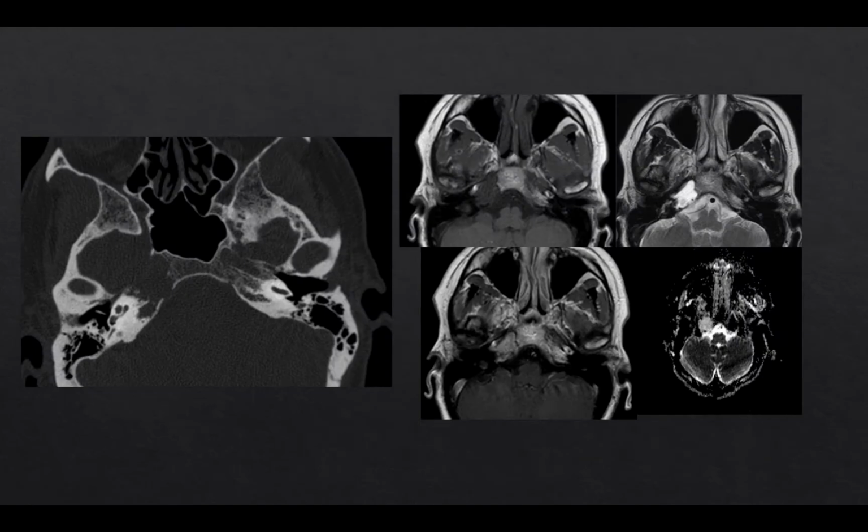Now let's get into more of the aggressive lesions of bone of the Petrous apex. On the right, we have a destructive lesion of bone with a broad zone of transition, cortical disruption, lack of internal matrix, centered in the region of the Petrous Apex, and of note, probably involving the petroclival fissure.